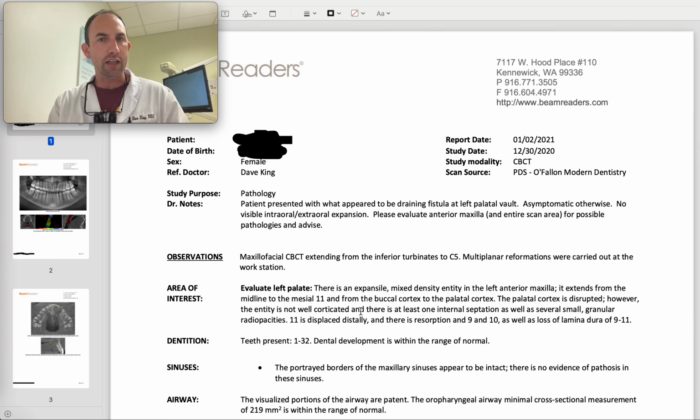So if I go through 3D and I diagnose and identify a concern for that patient, I'm going to sit down in the room with them after I've reviewed it and say, there's something here, like with this patient we have here on the screen. I'm not sure what it is. This looks like it could be something that might require additional treatment. I'd like to have an oral and maxillofacial radiologist look at the 3D image. The cost for that referral is $85. Are you comfortable with that? Or we can have the BC do that. I haven't had a patient yet say, no, I'm not paying for that, especially if they can see in the image this big black splotch that's there, just to make sure that they're aware.